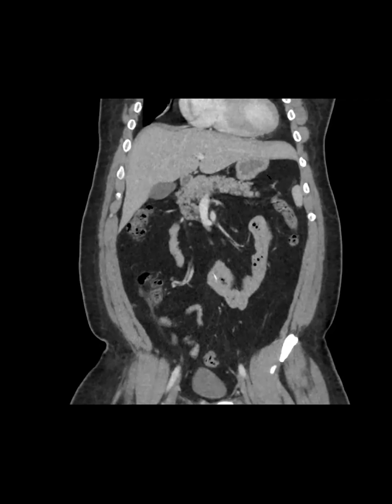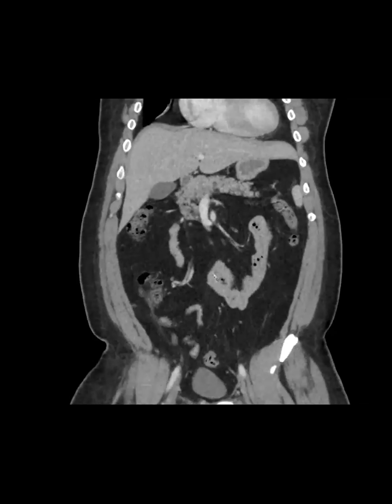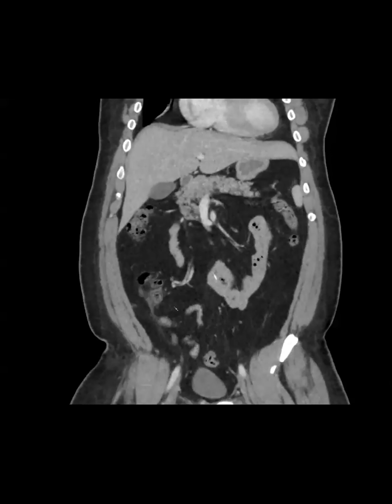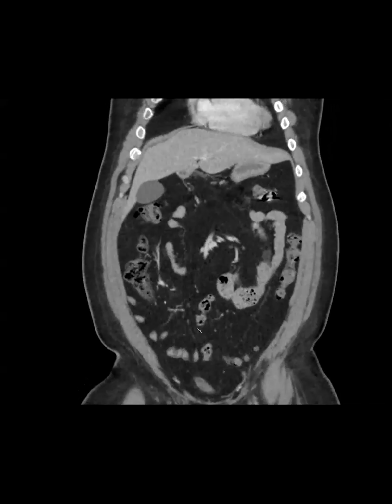I've seen a couple going into the vestibula, but you can even get them perforating out, causing an abscess and going all the way to the skin. The ones I've seen in the abdomen, either they're incidental or they've caused some major havoc. I saw one that went from the duodenum towards the SMV and caused a thrombophlebitis of the SMV, and then occasionally it can perforate. The two spots it's most likely to perforate are points where the bowel is either taking an angulation or is tacked down. So the two spots are the ileocecal junction and the rectosigmoid junction, because that's like a curve.